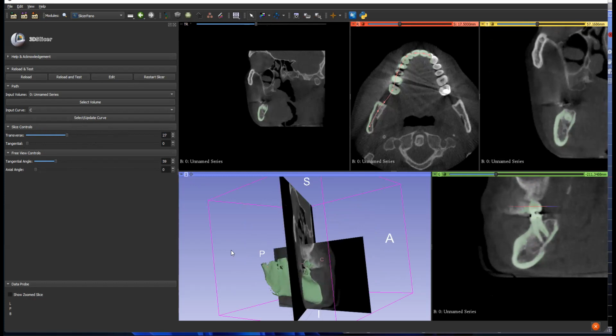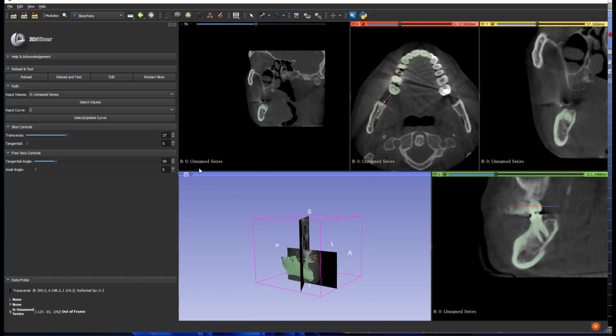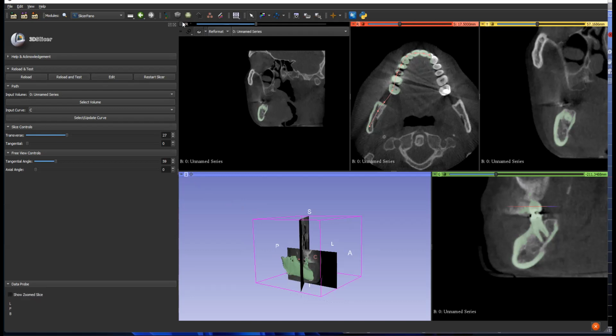But for this Zoom session, I personally only like working with one slice because it gets a bit confusing sometimes. So I'll just show you how to do it if we work with one slice. So in 3D Slicer, to hide your slices, you've got like a little link button here and a little eye.